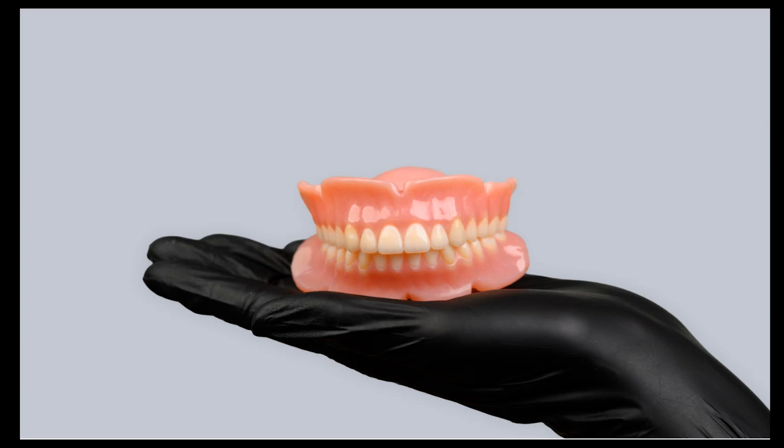And once you're happy with your results, arrange a nest if you didn't get to it before. The automatic option is facing all the teeth up, as this is the regular recommendation for TrueDent. This is also a requirement, sorry. You need to have the teeth facing up, and this is what the automatic arrangement does for you. But if you want to make it manually, just make sure that if you want to get the best results, or if you want to get True Voxel appearance in general, you have the teeth facing up. And that's it. Nest, arrange the tray, and send it over to the printer as you're used to.